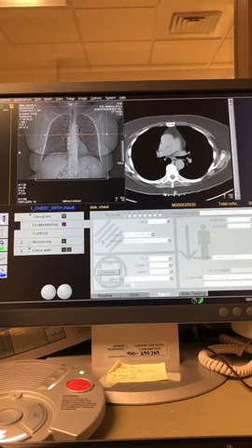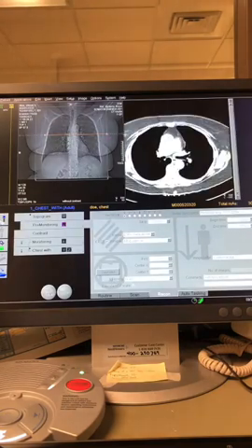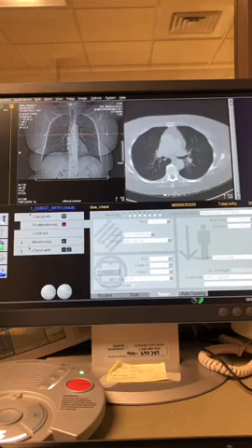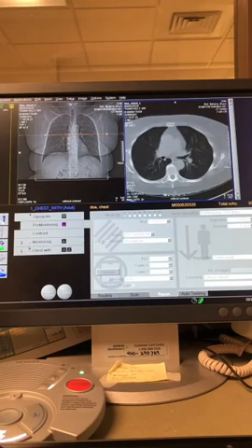So there's a lot of cool stuff you can see on this picture. If I window and level it, we might even get some lung parenchyma. Yeah, you can start to see the lung tissue. So it's pretty cool, right? Anyway, that's our pre-monitoring slice.